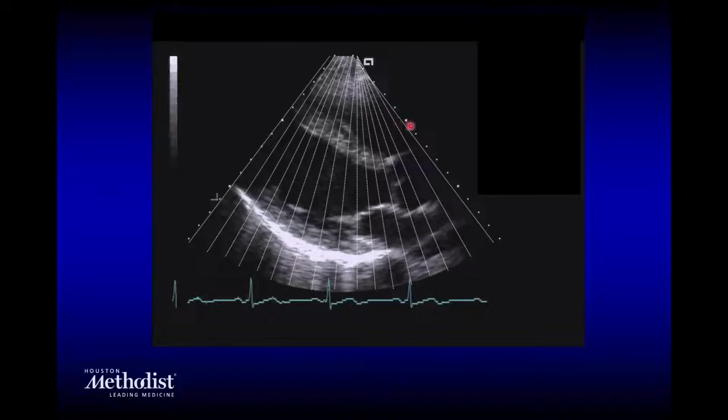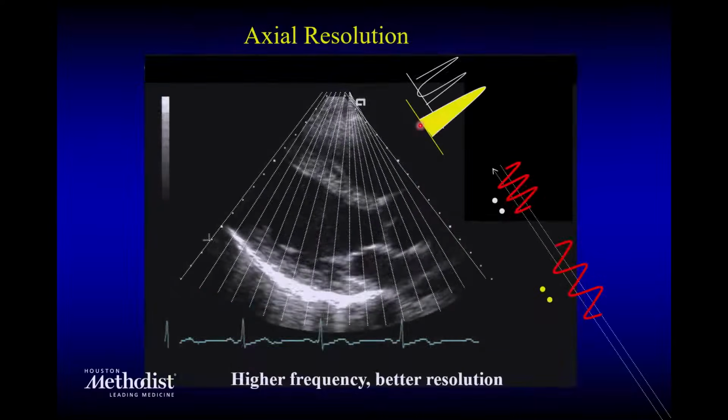And things have certainly evolved over the years, the frequency, the frame rate is quite fast nowadays, more than 60, at times 120 frames per second, which gets you close to a real-time view of the heart and its motion during systole or diastole.